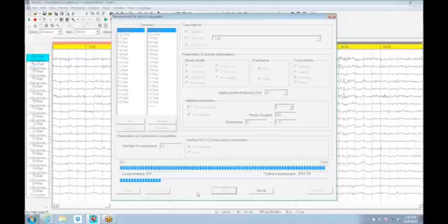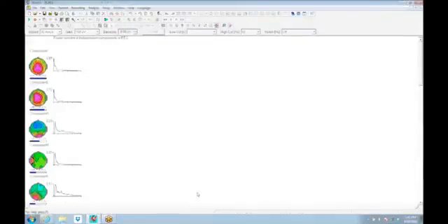And it takes time because of how intensive it actually is, and the exact nature of this specific EEG having some faster content and a few little artifacts here and there for it to sort out. Now that it's finished, the components are visible here. Their spectra are visible here.